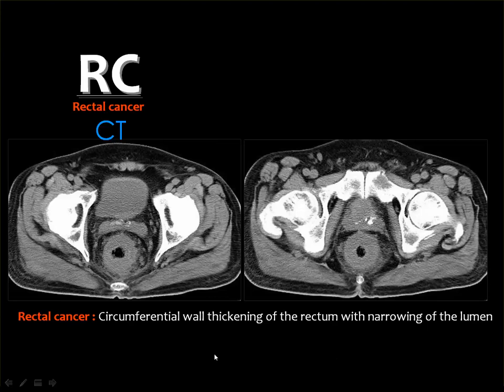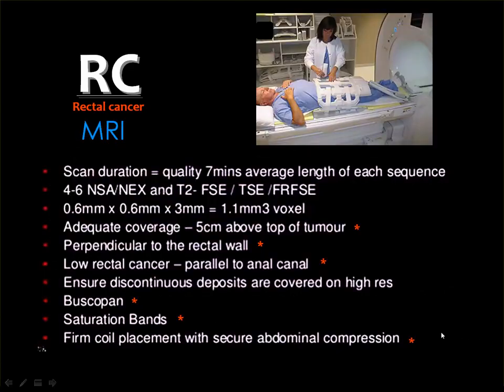CT actually has a limited capability in staging of rectal carcinoma because of its relatively low resolution. In this case, you can see circumferential mural thickening of the rectum with stranding of the perirectal fat, as well as minute mesorectal lymph nodes. MRI, according to the literature, is the best way for diagnosis and staging of colorectal cancer.